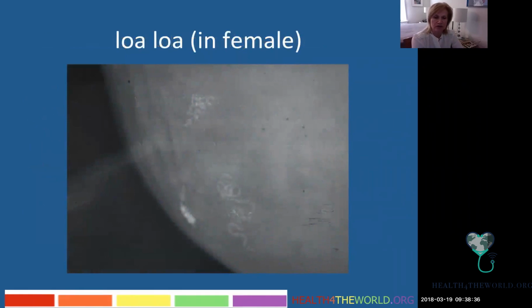We don't see this much in this country, but in other parts of the world, parasitic infections are very common, a common benign affliction in breast tissue. Obviously more often in females than in males. This is an example in a female. I don't have one in a male, but if you happen to do a mammogram in a male for another reason, say a lump that's a cancer or gynecomastia, you might see evidence that there has been a previous parasitic infection like loiasis, and you might see these calcified evidence of the worms and the inflammatory response.